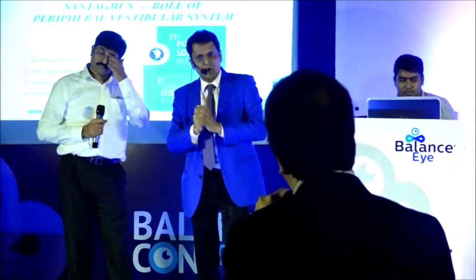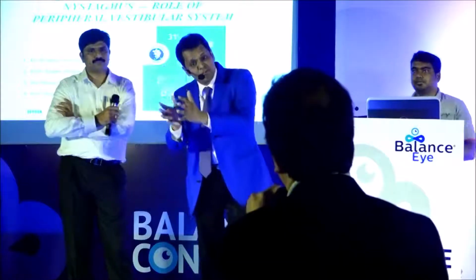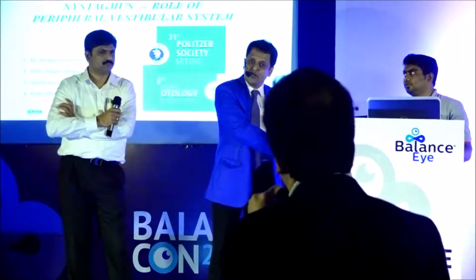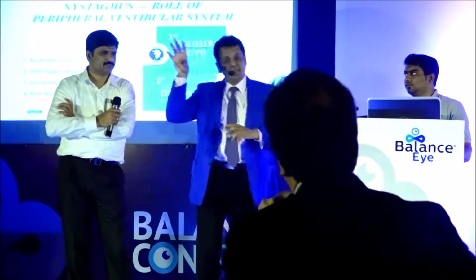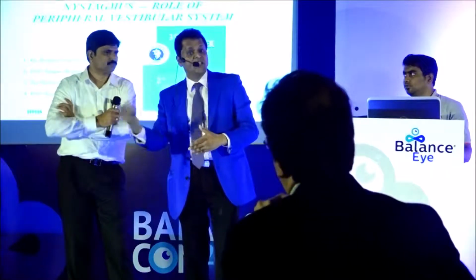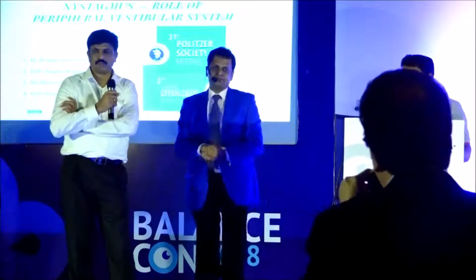On a T1 or a T2, it could actually look black, and you might think it's a tumor, but the fundus is a much more crowded area compared to the porus acousticus. There's a little wider space, the nerves are a little wide apart, but the fundus by default is a crowded area, and you might either overdiagnose a tumor or miss one. Sure. Okay.